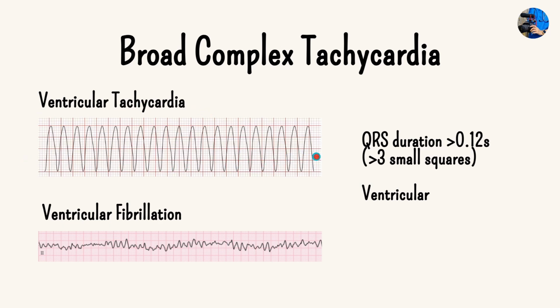That is what it looks like, and you can see here that actually, unlike the atrial tachycardias where the ventricles were okay, they were quite normal, these ventricular tachycardias and ventricular fibrillation are a lot more serious. You're not having those P waves, you're not having good conduction throughout the heart at all. So these are a bit more life-threatening, and the ones where ALS and life support and that sort of thing comes in. Okay.